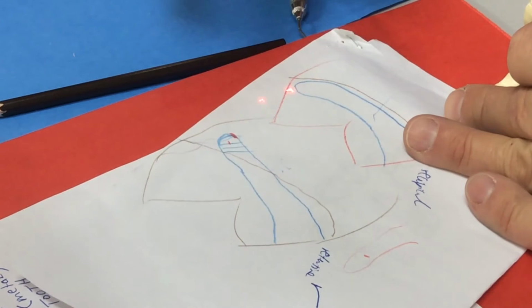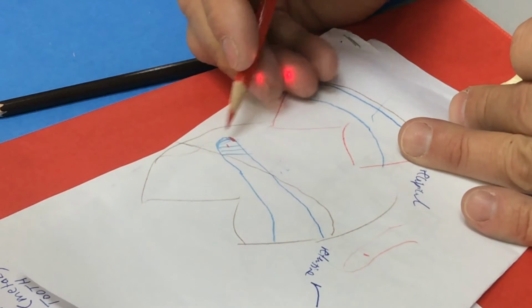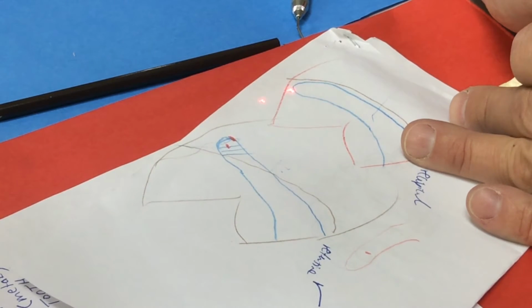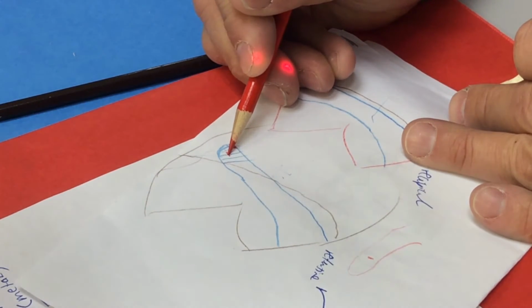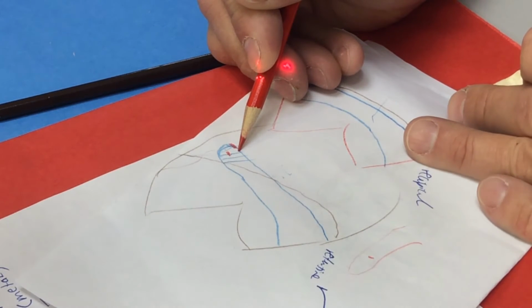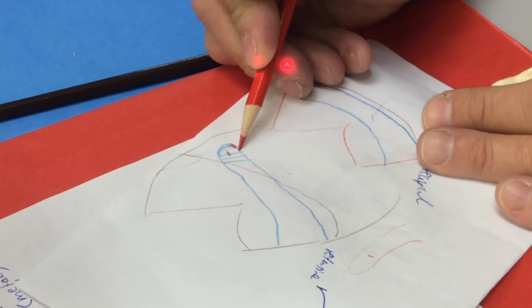Because this is on a horizontal surface and the eye bar is on the vertical surface, it does a whole different thing if you enclose that undercut mark there. Because if you enclose it there, this part of the clasp right here would be 0.01 inches below the survey line. This part of the clasp is in 0.01, 2, 3, or 4, somewhere in there. This is in more of an undercut than you want it to be.